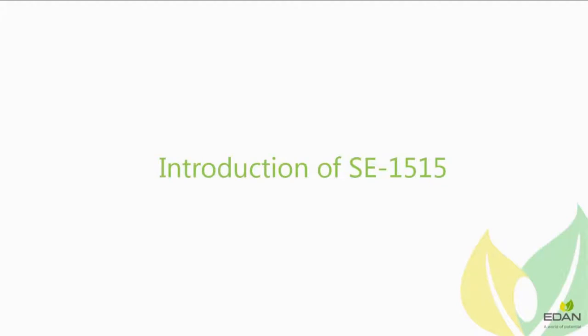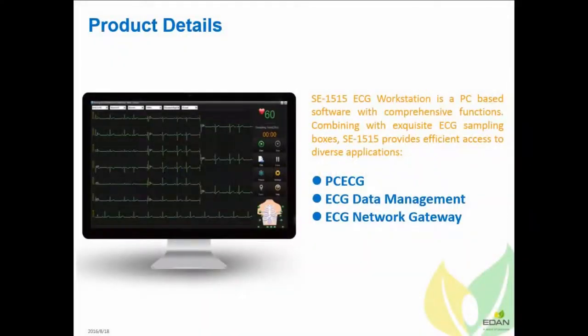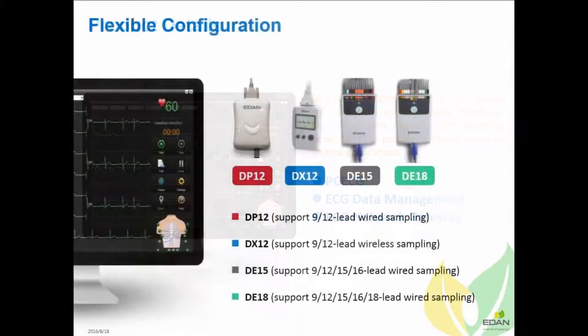SE 1515 Brief Introduction. EDAN SE 1515 is a PC-based ECG workstation that works in conjunction with ECG sampling boxes.